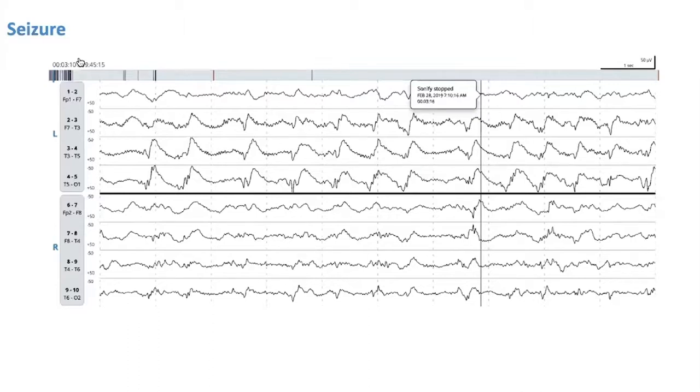And John, I don't know what you think, but when I teach our fellows, I usually say, think about a big hollow space, and then you're putting electrodes over the ball, like a sphere. These EEG electrodes are not necessarily just recording activity underneath the electrode themselves, but it's actually the average of the whole sphere collected best from that point of view.